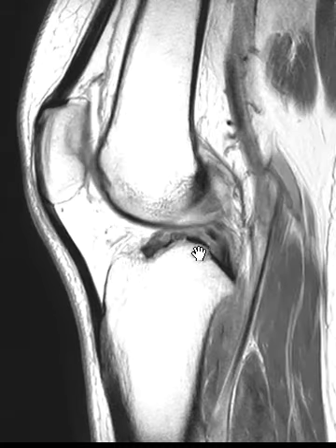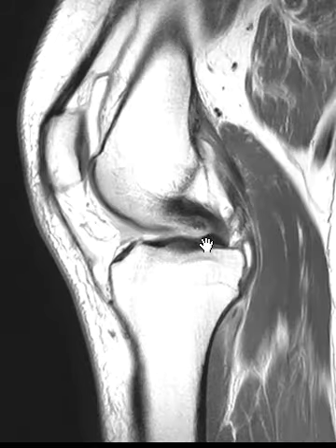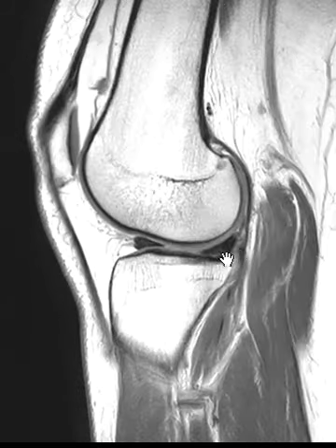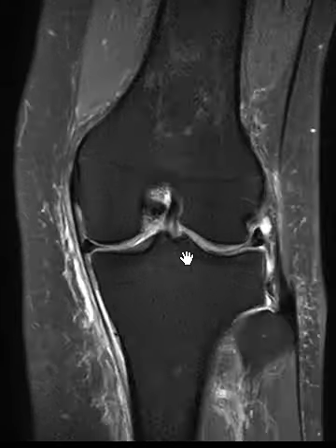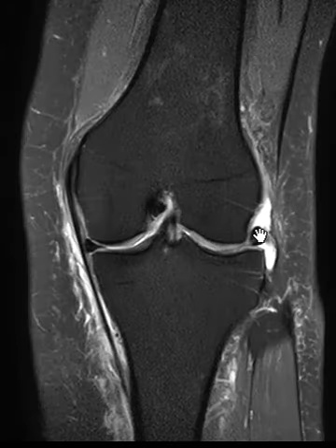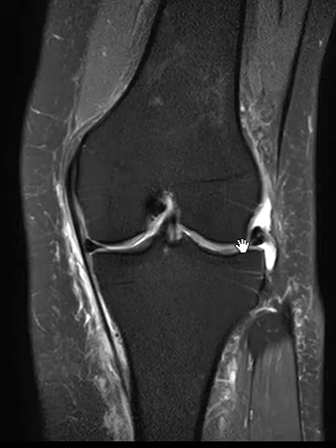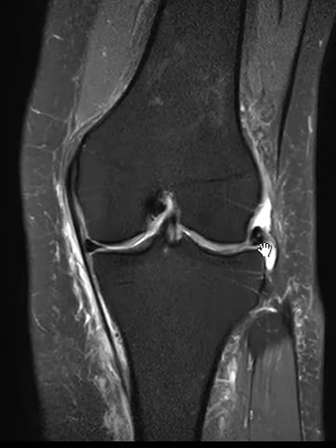And when these tear, sometimes the meniscofemoral ligament of Humphrey, or if it's in back, the ligament of Wrisberg, will hold on and it will not have much loss of hoop stress. But in this case, there is loss of hoop stress. We can look on this coronal view here, and we see the lateral meniscus body is pseudo-extruded. There's loss of hoop stress and a little degenerative type inner third tear and blunting of the inner free margin of the meniscus. Abnormal morphology. So when we see this pseudo-extrusion, you know something's going on.